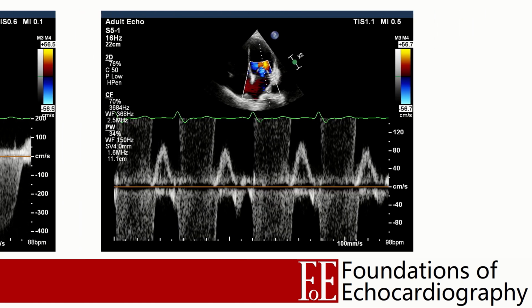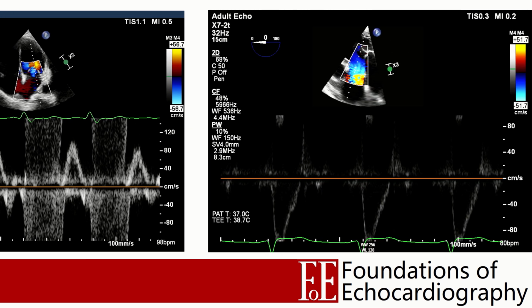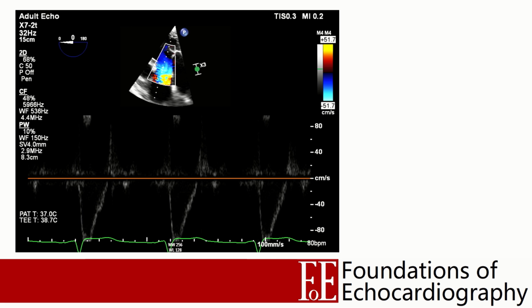Now, if we then compare that to a pulsed wave Doppler graph, we can see our LV filling accurately displayed, but during systole we have these solid blocks of velocity data, as the blood is travelling far too quickly to discern either velocity or direction of travel. This is the pattern we see when the velocity is more than double our speed limit, but aliasing is not always as dramatic as this.